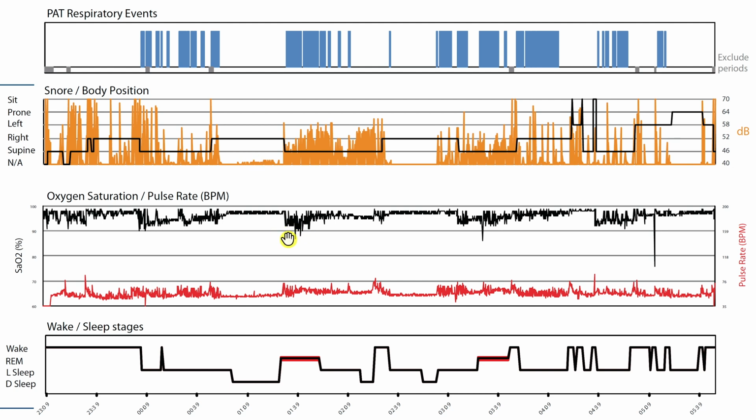So anyways, this is oxygen saturation as percentage. So anything between this gray line and this gray line is 100 to 90%. You can see it drops below 90% a few times. There's one big one here. Another thing with pulse oximeters, sometimes there's artifacts, meaning you move the little sensor and sometimes there's huge drops and people panic about this.